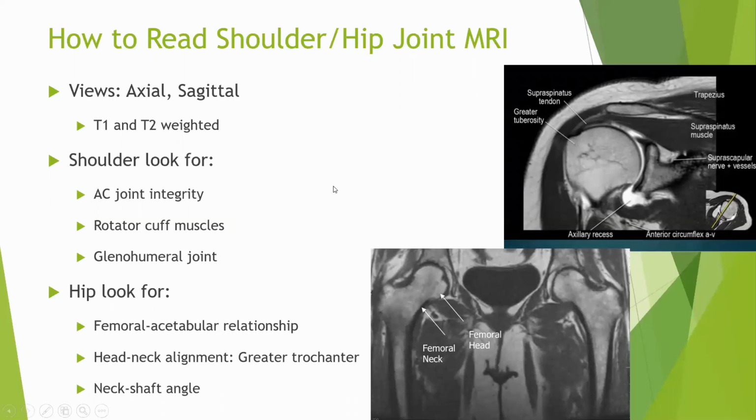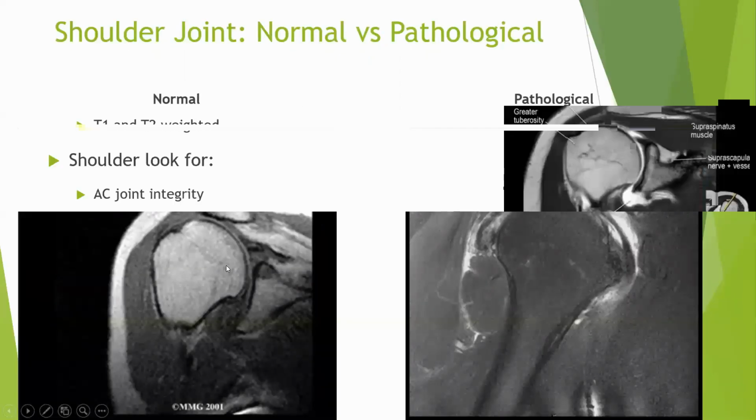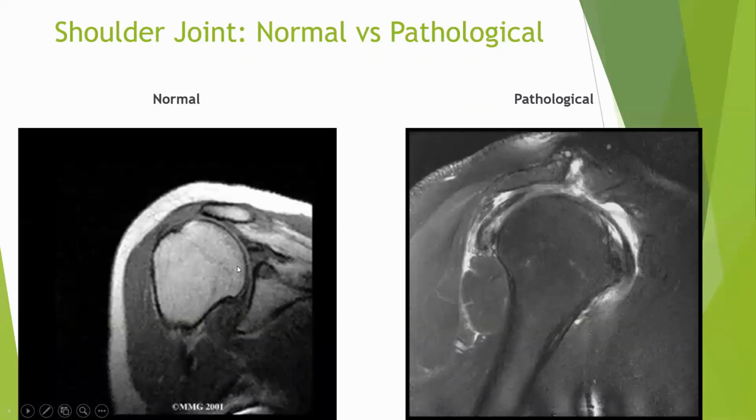All right, shoulder joint pathology. Now, remember, I am only showing you one slice of probably 16 or 32 slices that you will actually be seeing, from anterior to posterior, lateral to medial, inferior to superior. 32 slices or 16 slices, and I am only showing you one slice. So obviously matching the slices also matters a lot. That is why I told you, look at which slice you are looking at, either on the top left corner normally or sometimes the top right corner. Always match which slice you are looking at. Otherwise, you'll be extremely confused. Okay? Very, very important.